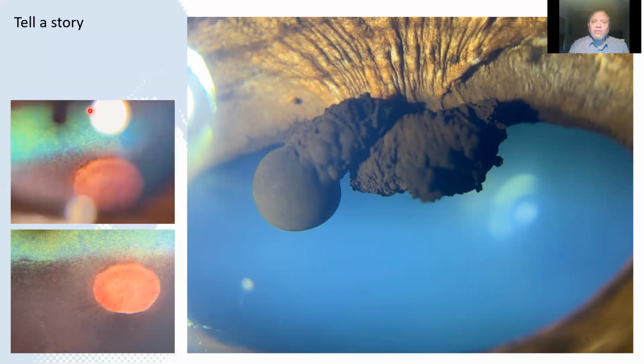In this particular horse, there were behavioural abnormalities consistent with it being aware of the cyst and moving abnormally during exercise, and following removal of the cyst, those behaviours resolved. So these images help support our supposition that the cyst was clinically significant in this horse.